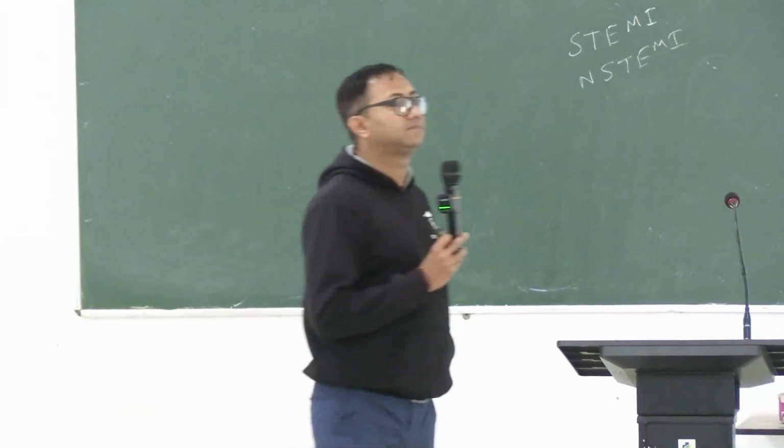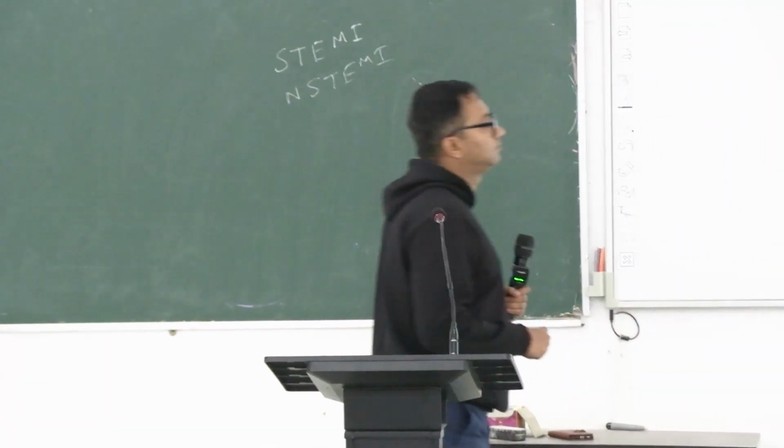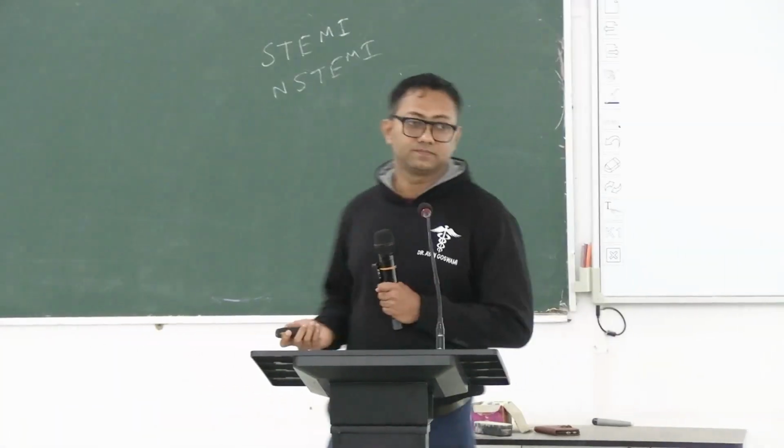What do you see? Just look and tell me. Yes.